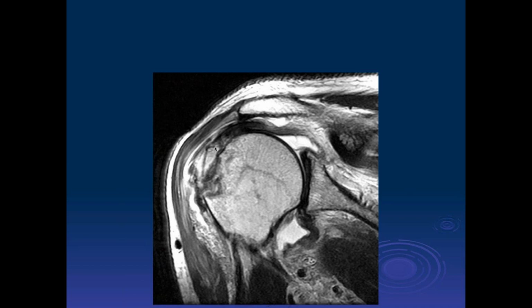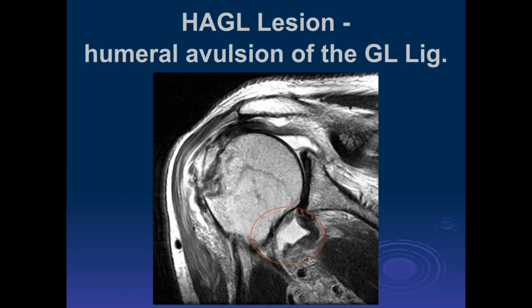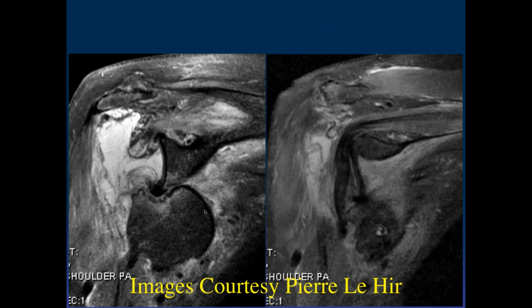And then what about all this bone injury here? So we have impaction injury of the lateral humeral head. So what's the mechanism? Again, it can be direct impaction injury, or it can be like a vertical dislocation. This was an inferior dislocation. Okay.